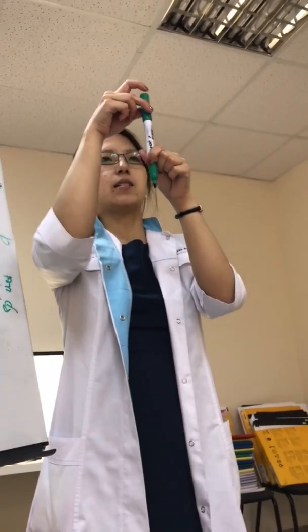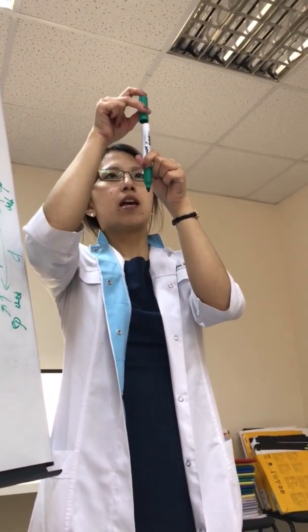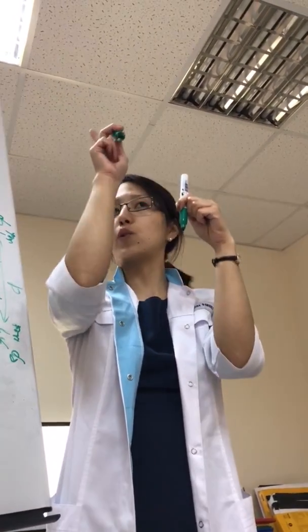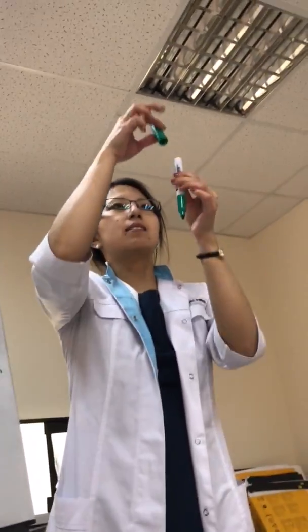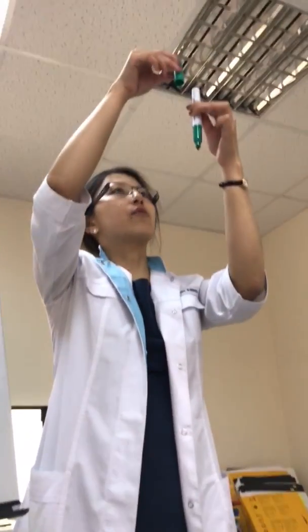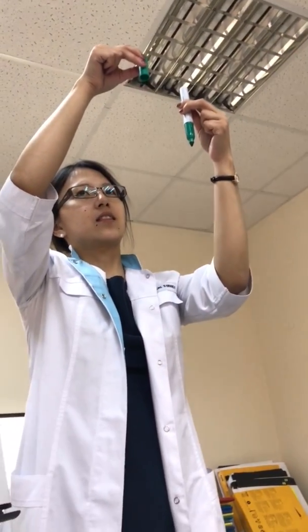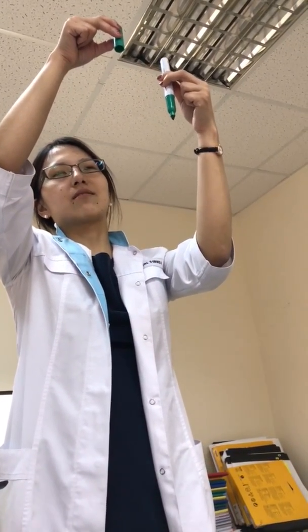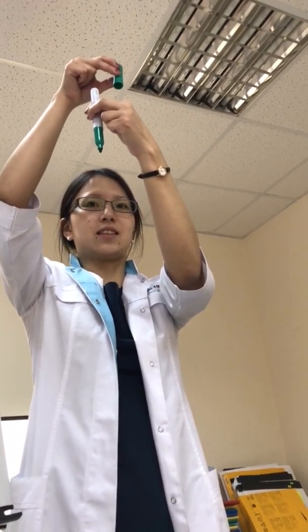Look at me now. For example, this was a bone, yes? This is line of fracture. If this fragment going here, which displacement it is? Laterally. No, you should begin with this word, by width. Let's do it again. For example, this is a left femur. By width laterally. This left again. This is left femur. By width medially. Yes, this. By width medially.